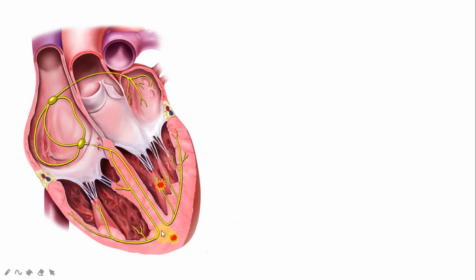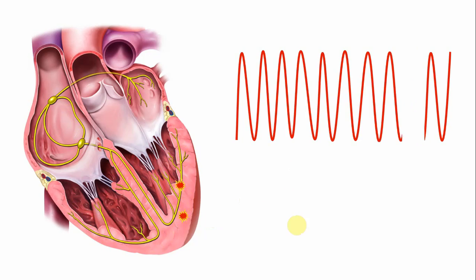So let's assume that this patient has got a lesion in the apex of the heart, and so the cardiac impulse is generated from the apex of the heart at a very fast rate, more than 110 beats per minute, and that is then spreading to the rest of the ventricle. And if you do the ECG, you will find a weird looking ECG which is almost like this.